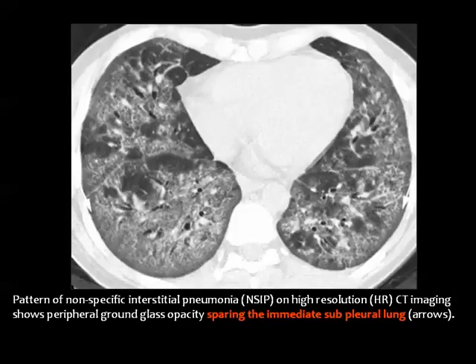For the purpose of bronchiectasis, is there a cutoff size to say that this is a normal bronchus or an abnormally dilated bronchus? You just look at a bronchus and the adjacent vessel in cross section. It is normal to see that the vessel is the same size as the bronchus.